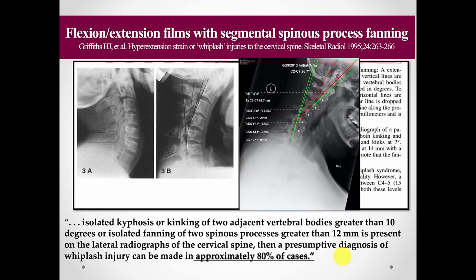So here in PostureRay, you have yet another method of instability analysis. So you can be super thorough with your abilities to diagnose the possibility of ligamentous laxity in your patients.